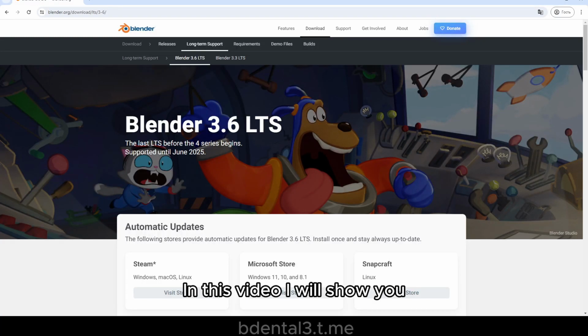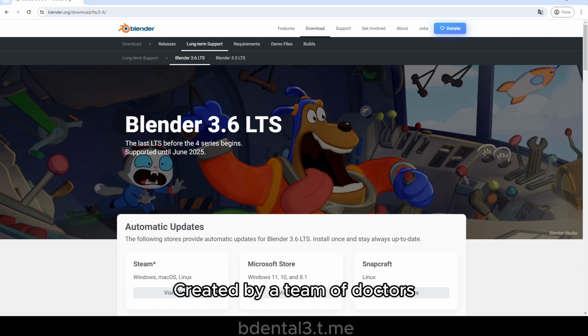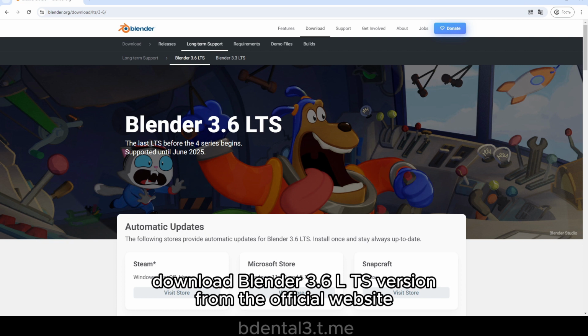Welcome. In this video I will show you how to install and configure Bdental. Bdental add-in is an open source project for navigation surgery, created by a team of doctors as a free add-on to the Blender 3D. To begin with, we need to download Blender 3.6 LTS version from the official website.